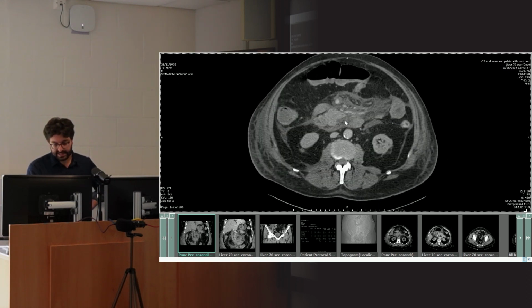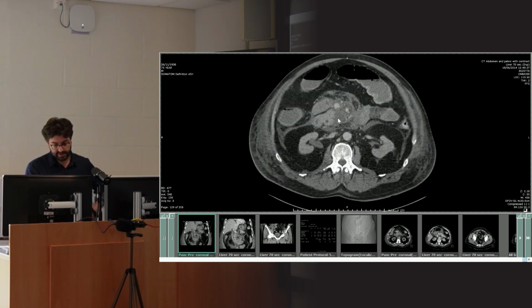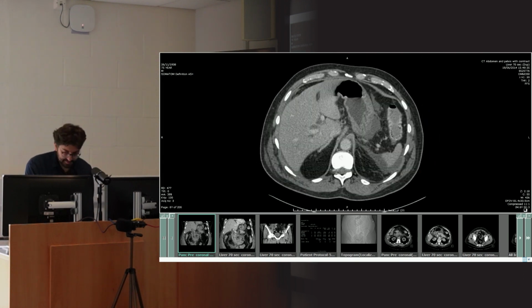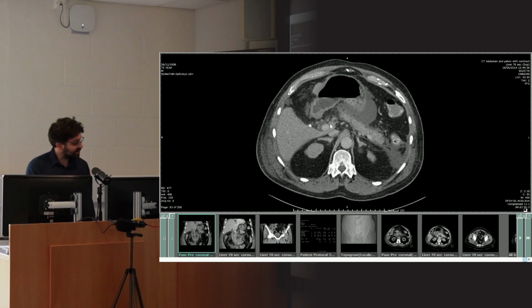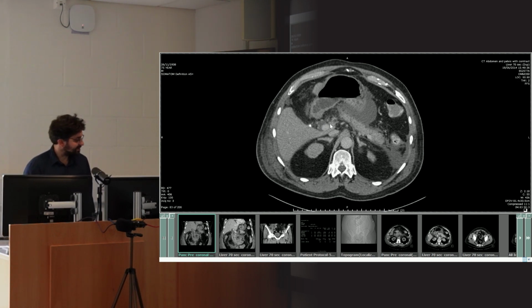A bit further down, you can actually see the uncinate process then sort of recovers, but as you go up, you see this big portion of the uncinate process just disappears. You've just got this section of necrosis there. In addition to that, what else are we going to be looking for? Well, what are the common causes of pancreatitis? Gallstones and alcohol. Yeah, that's probably the two commonest, third being ERCP.